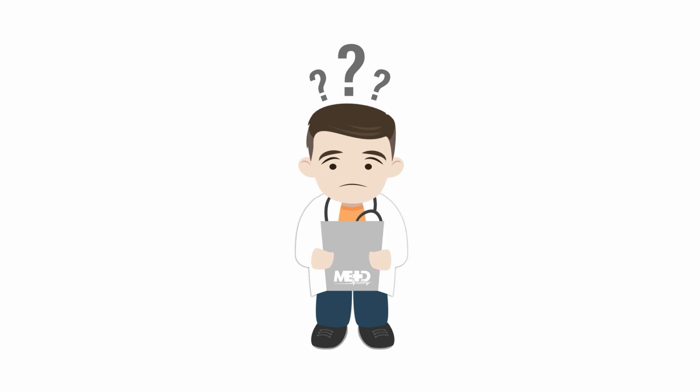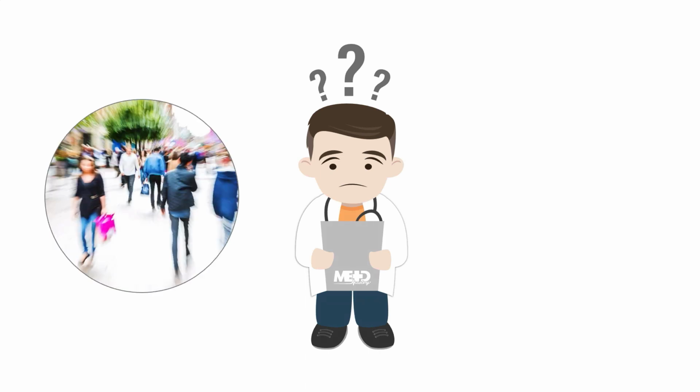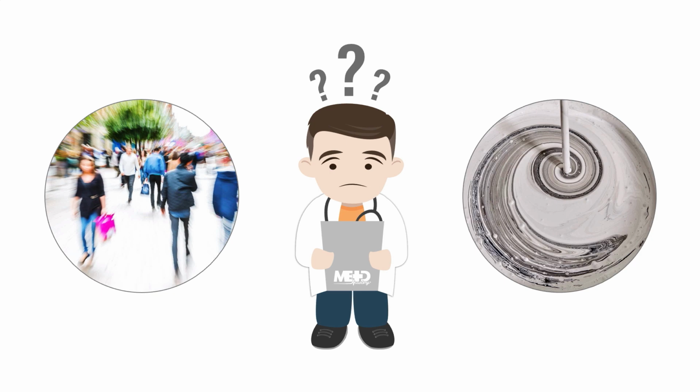Often, CT images have some blurring due to patient motion, and the vessels can be affected by mixing artifact. Mixing artifact occurs when blood with different amounts of contrast mixes together and creates lines or swirls in the vessels, but these limitations do not prevent us from trying.